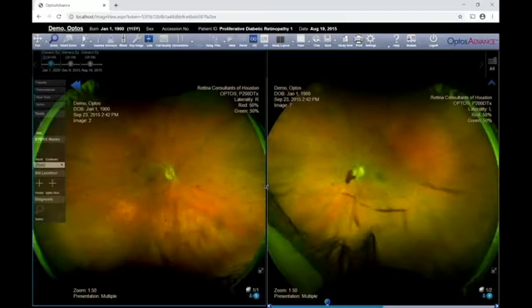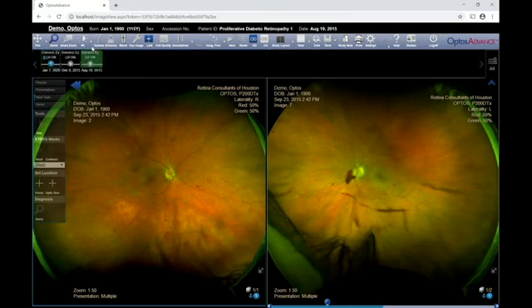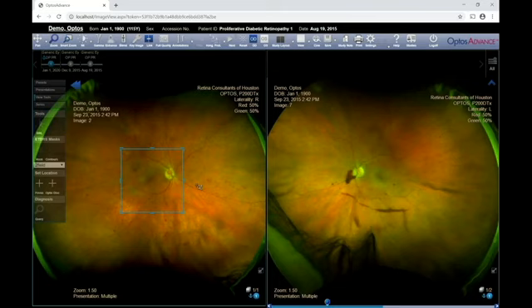Another useful feature is Smart Zoom, which can be employed by clicking the middle scroll wheel while the cursor is over an image or selecting the Smart Zoom icon on the toolbar. An overlay window will be applied onto the center of the image. You may also adjust the size and position of the overlay using the corresponding tabs.